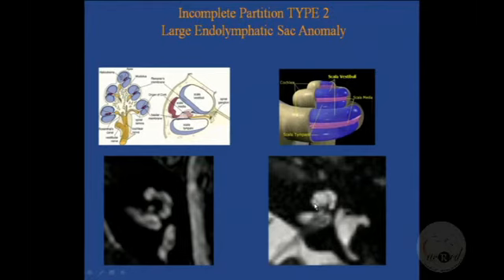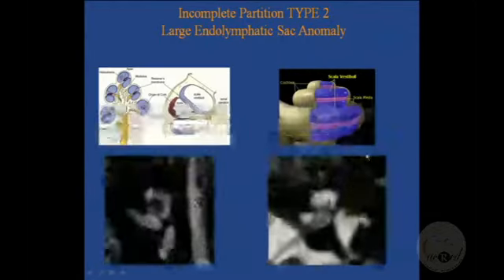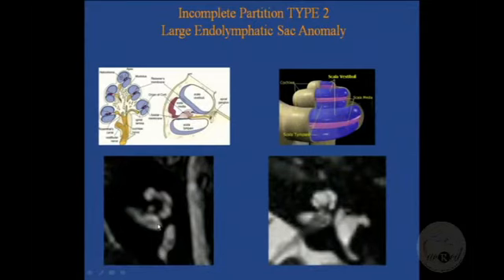But sometimes you can see it on the CT as a dysmorphic apical turn. The basal turn is very well formed, and the apical turn is short and dysplastic. That's how it looks on the CT. And if you do a high-res MR, I don't know if it is projecting very well on that one. Is it clear enough? Yeah. Because I really had a tough time getting the image quality, because once I magnified it, it became very pixelated. So pay attention to the inner details of the cochlear turns.